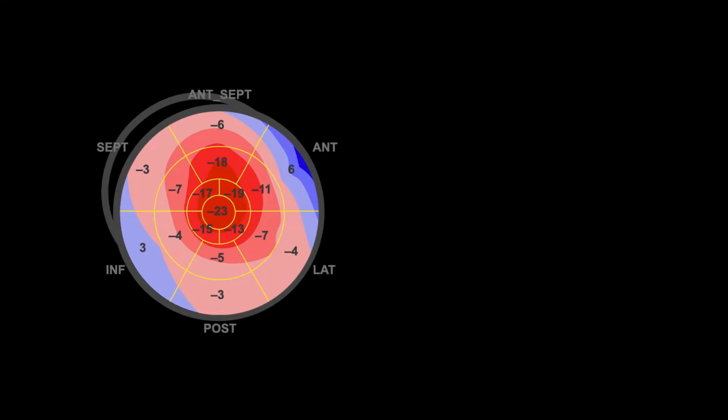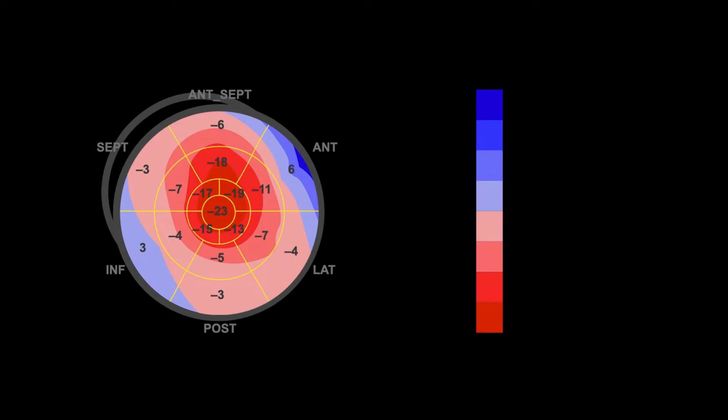Qualitatively, the color representation on the plot and color bar help to visualize and understand myocardial contractility at the segmental level and provide an overview of the entire left ventricle. Red represents normal left ventricle wall contraction, as in shortening of the muscle fibers. Lighter red or pink indicates that the left ventricle wall is hypokinetic, meaning that the wall is not contracting normally or its function is reduced.